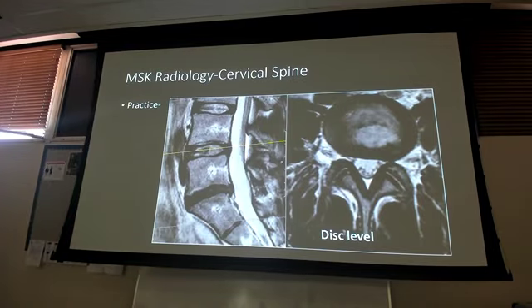Here's another one in the lumbar spine. See how it's closer up now so I get a better visualization? These are my intervertebral discs. But I have a small bulge right here. This is not causing that patient any back pain whatsoever. But the advanced radiologists will be able to look at the nerve roots sitting in here, and I can't really quite see it there, and see if the nerve roots are impinged.